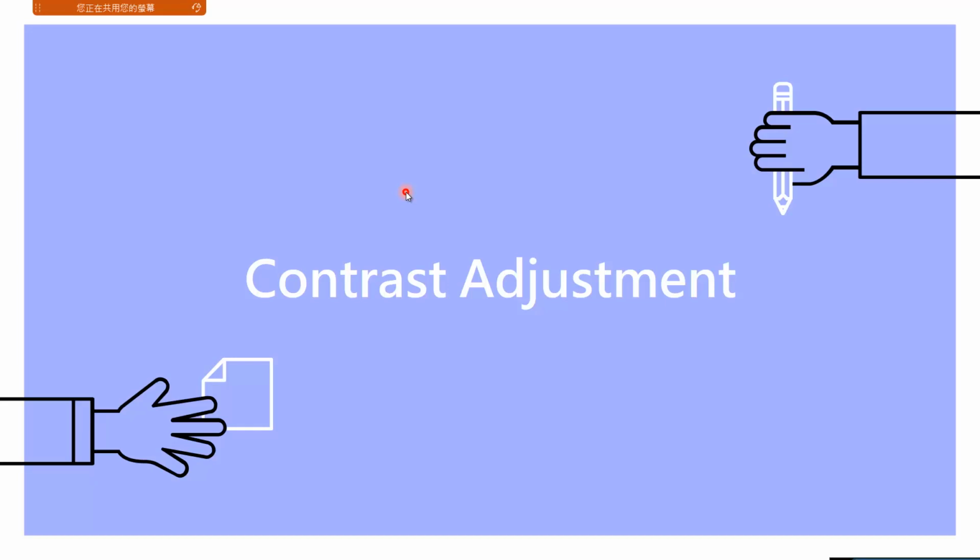So I think we can start the second part right here. We're going to use what we learned for the structured array. We try to give the example about the image contrast. And most importantly, we are going to learn how to adjust. Adjust means change. Can we change the image contrast so we can better see the medical image, or specifically observe the medical image, okay?